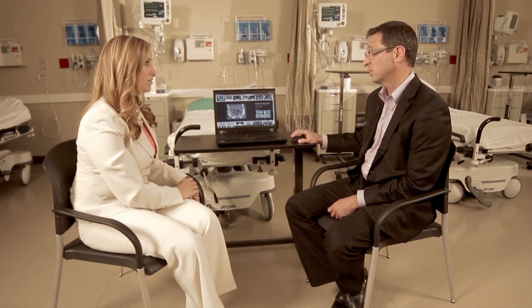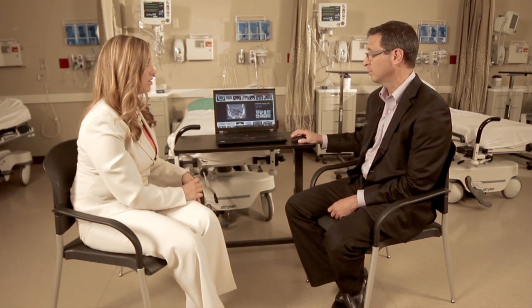So this person's going to have a stuffy nose, they're going to have thick drainage, they're just going to feel awful. And this is someone who will be sometimes seen in my office, or even if they're seen by their family doctor, will get on antibiotics. Sometimes an x-ray like this, unfortunately, will be seen when someone's already been on all the medicine they can be on and they feel no better at all.